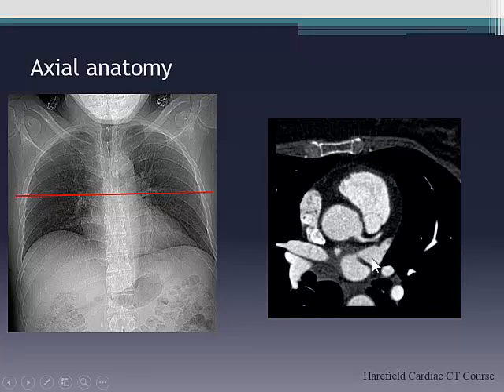Okay, so again, you can see the left atrial appendage. Now we're getting the pulmonary veins. Remember, the pulmonary veins will always stay with the left atrium, so it's a way that we try to identify the left atrium whenever we're looking at congenital cases.